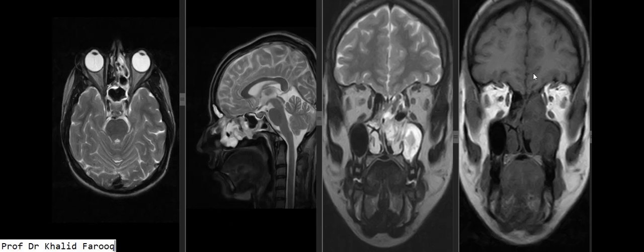So whenever we suspect any fungal infection or aggressive nasosinus polyposis or tumor, it is mandatory for the radiologist to rule out involvement of adjacent structures, that is orbits, cavernous sinus areas, or brain, and we have to mention the status of the bony boundaries, especially cribriform plates, lamina papyracea, and boundaries of sphenoid sinuses.